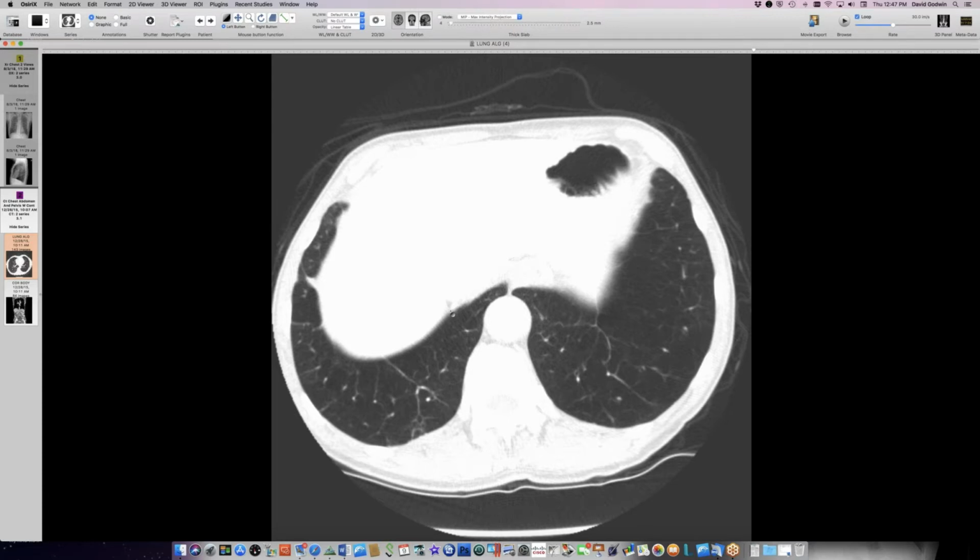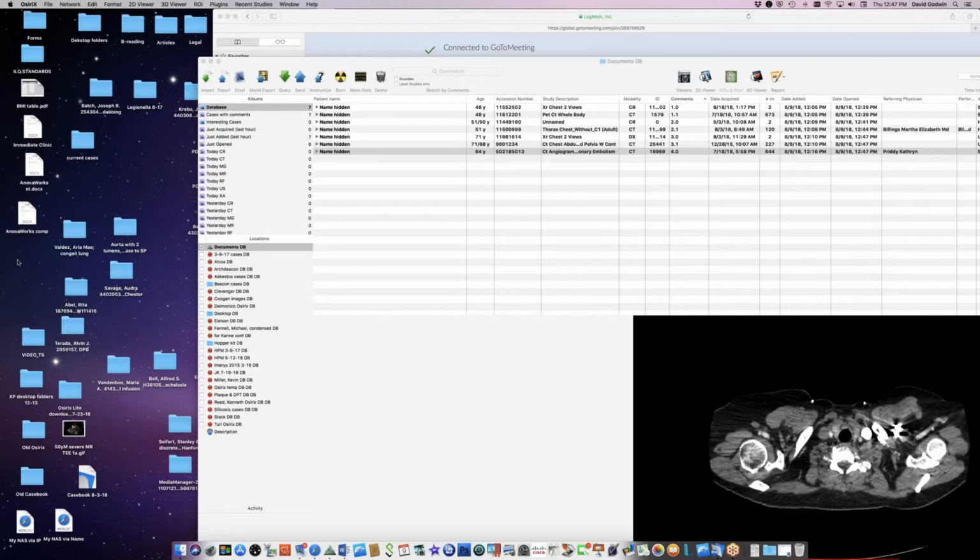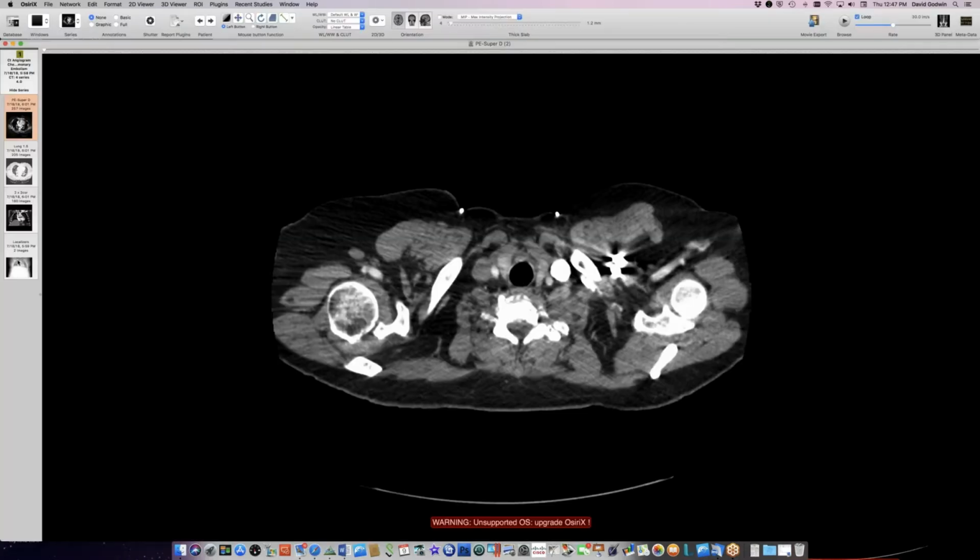So he injected the Ritalin? Yeah, right. It's injected Ritalin, and he's got maybe a little flattening of the diaphragm here on lateral view, and maybe a little pulmonary hypertension here. Okay, so very nice imaging findings here.